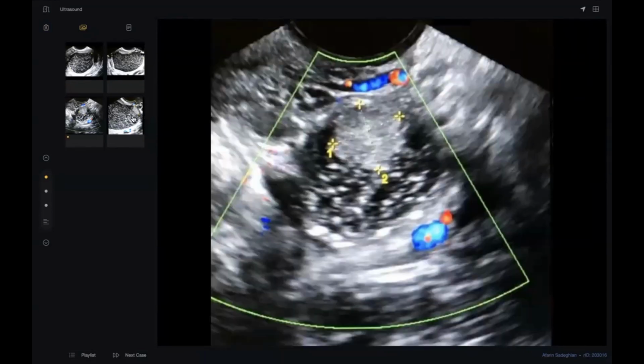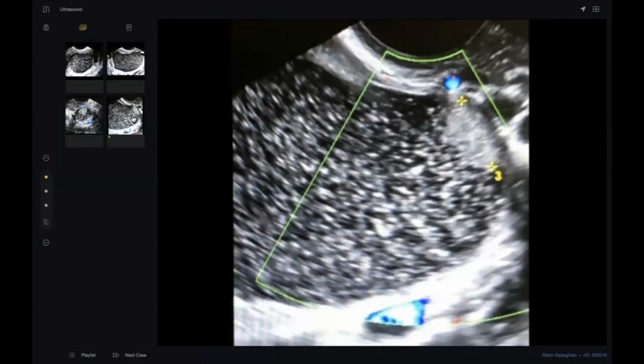I can see that there is evidence of an echogenic lesion, a cystic lesion with mixed echogenic content noted within the pelvis. I can see also that there is evidence of a hyperechoic soft tissue lesion within it with heavy internal echoes and posterior acoustic enhancement. I couldn't see any Doppler noted within the soft tissue lesion. As this patient is complaining of pain, it's not clear in which adnexa this lesion is.